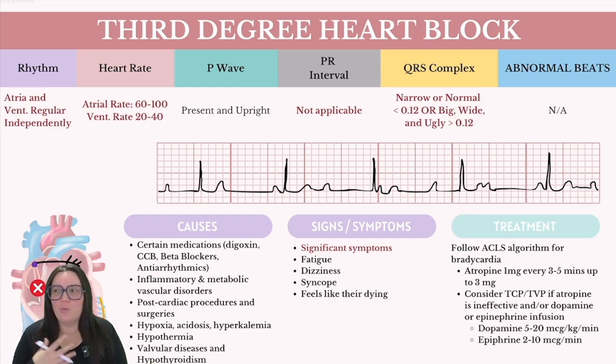So you might be questioning, why is this heart rhythm lethal? Well, a third-degree heart block is lethal because the ventricles rely on their backup pacemaker systems known as their Purkinje fibers, which are primarily slower and less reliable than our normal sinus node. This can ultimately lead to reduced cardiac output, leading to severe symptoms if not adequately treated. And the risk of asystole increases greatly when it comes to this rhythm because it's relying on those escape rhythms in order to make the ventricles contract.